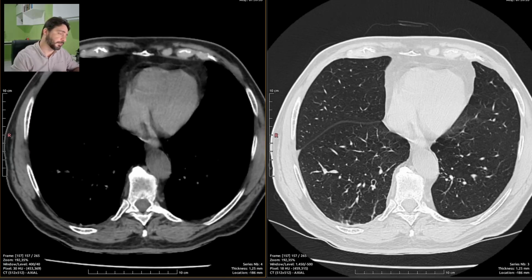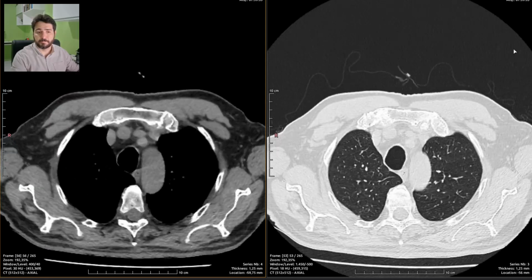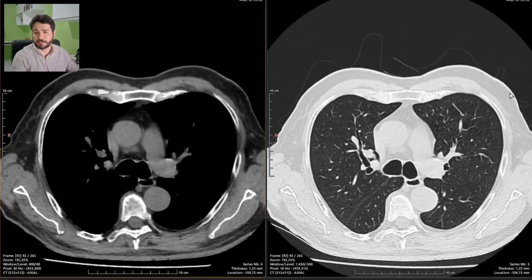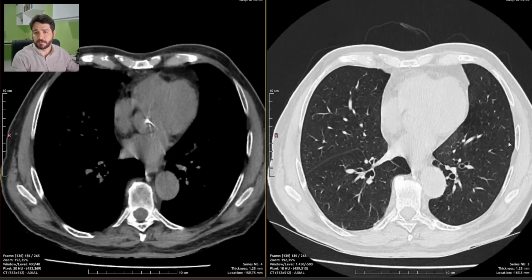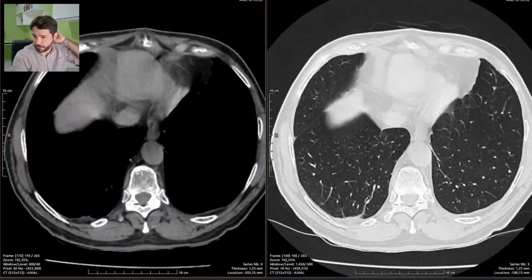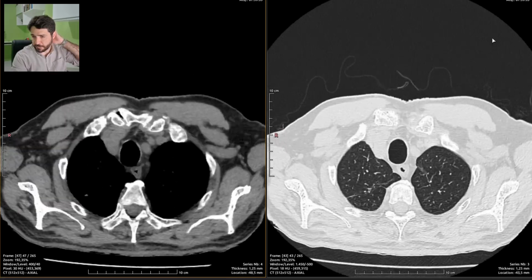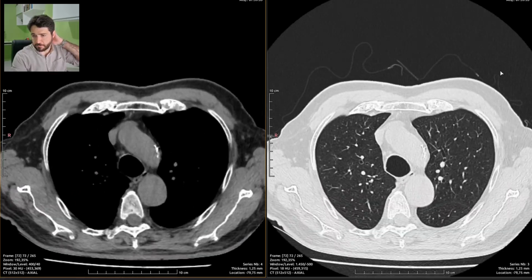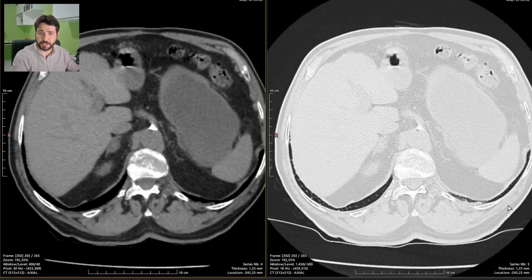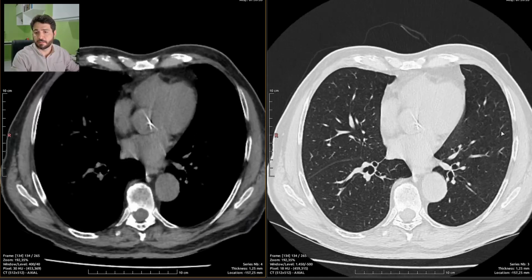One very important tip for such cases is you guys can readily see that this is a very well done CT scan. This patient is quite old, 91 years old, and there really aren't many breathing motion artifacts on this exam, so it means the patient isn't severely ill.